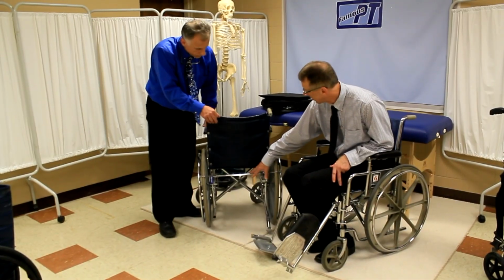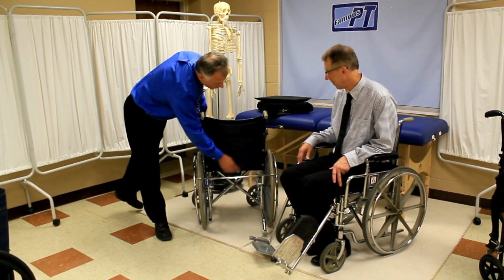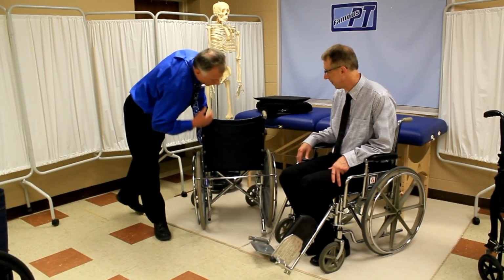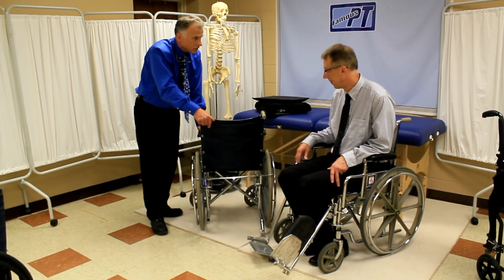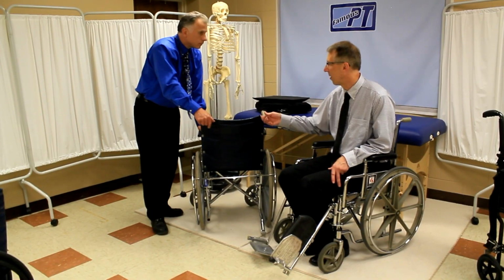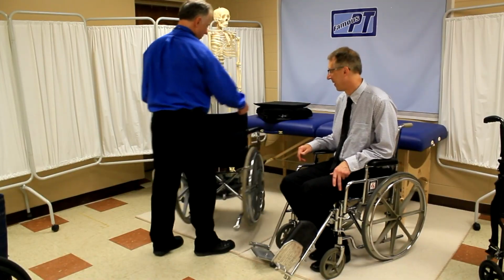It's quite an involved piece here, it's not a minor thing. It's an attachment you can get for most of these chairs. I don't know if it's a couple hundred dollars or whatever. And you have to have someone skilled to put it on and adjust it. And plus when you try to push a chair around, you have to put some weight in there, because it locks up on you. Or I usually just go like that.